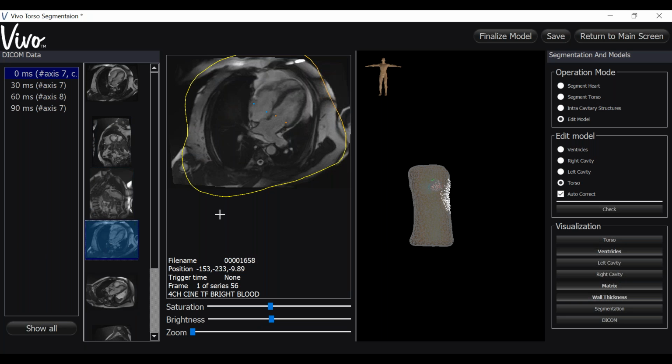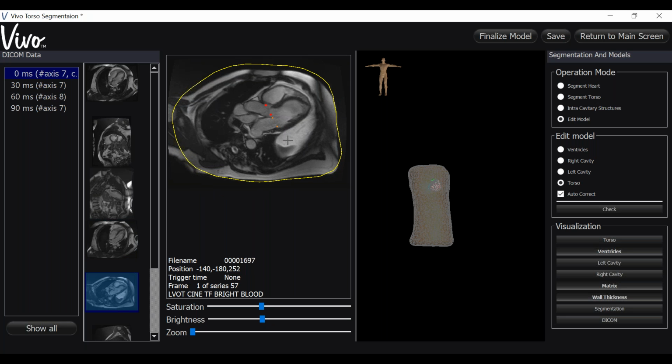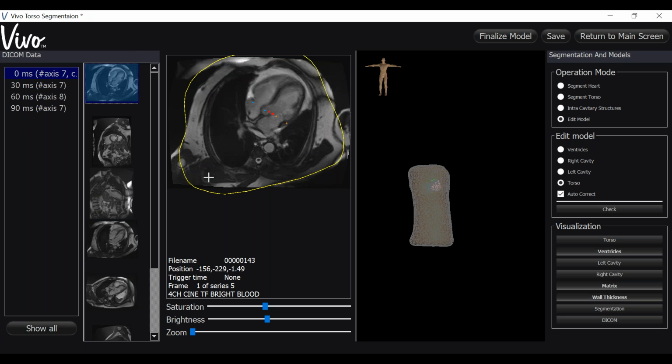And if you have an area down here that's solid black, you can't control the outline from this area. You can only control what's within the image frame itself. So this is lining up pretty well.